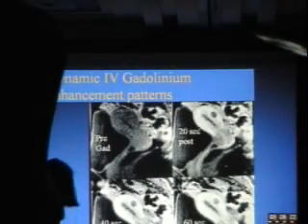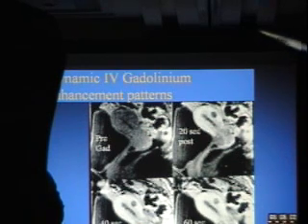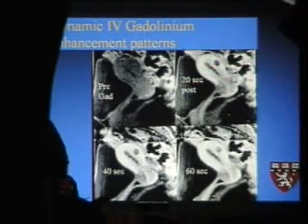Gadolinium enhancement patterns, an important thing to know. This is the same as it will be on CT, and we're doing CTs finally a little bit better in the pelvis than we used to. So we're now getting these kinds of images almost, and we're not quite there, we'll never be quite there, will we? But with CT, with the bolus of contrast, you can really begin to see the differential enhancement between the cervix and the uterus, between a fibroid and the myometrium.